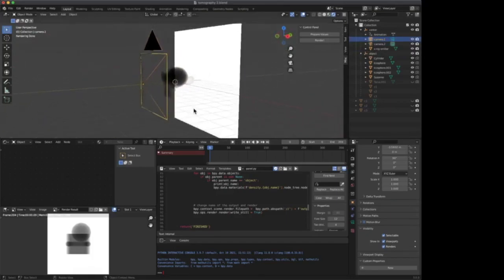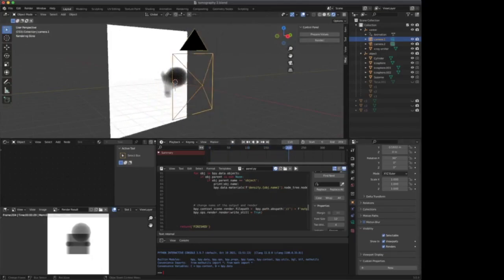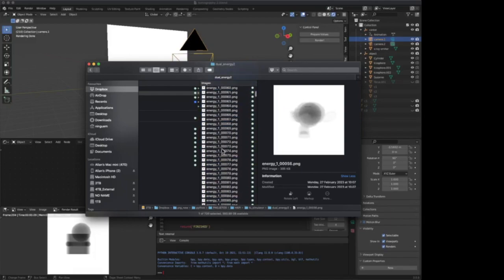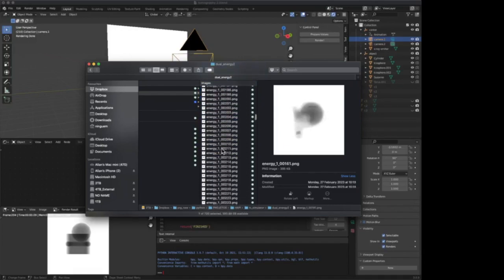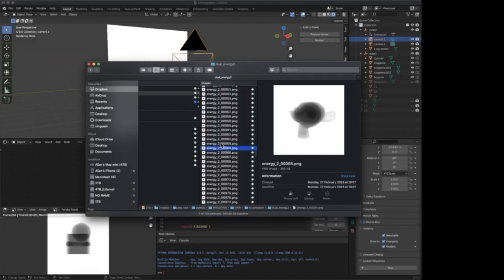After the drawing is done, we click the button to scan the object. When the scan is finished, we will have two sets of X-rays, one for each energy. Each set will have images corresponding to an angle defined by the animation timeline of the template Blender file. They will correspond to the angles of the CT machine. With that data we will have all we need to test the reconstruction algorithms, but now we will have the ground truth of the exact object that should be reconstructed.